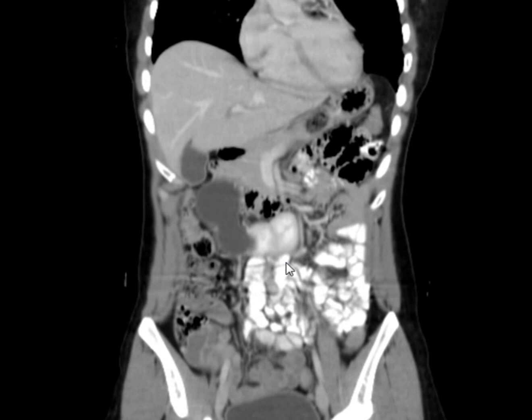Third, the most important question: is horseshoe kidney an easy diagnosis by ultrasound? Usually ultrasound comes normal. It's very difficult to see horseshoe kidney by ultrasound. So when you have a normal ultrasound and you do a CT scan and there is a horseshoe kidney, don't say, who did this ultrasound? He's stupid. No, this is the usual story. It's usually difficult to diagnose by ultrasound, especially if it's fibrous. Excellent. Malrotated, okay, but you cannot always see the connection, and you should keep suspecting it until you see it.